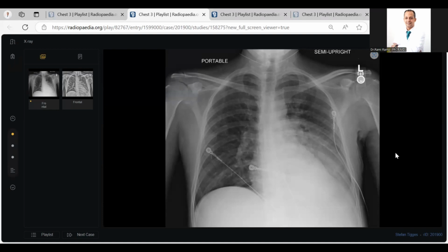A 35 years old male patient with hemoptysis. I am presented with an X-ray chest frontal projection of a skeletally mature patient who presented with hemoptysis. On gross abnormality, I can see there is homogeneous opacification of the left lower hemithorax. There is loss of silhouette of the left hemidiaphragm, and there is also haziness along the left pericardiac border.